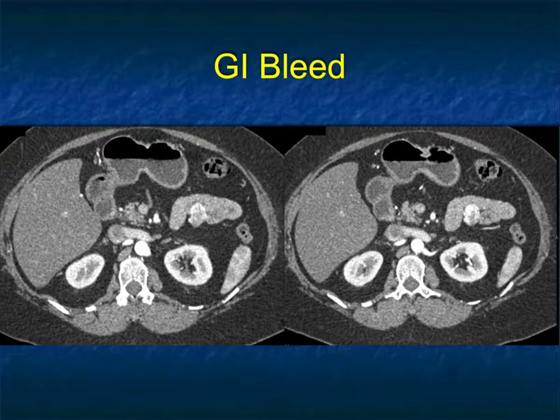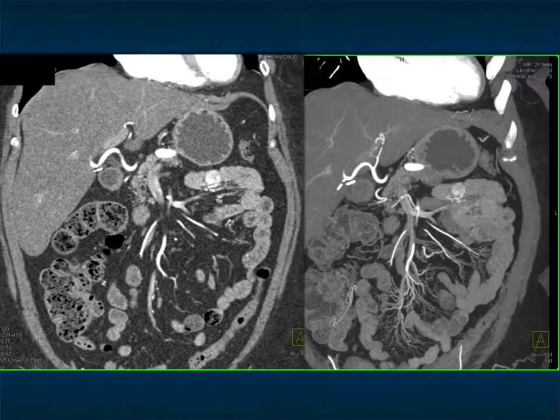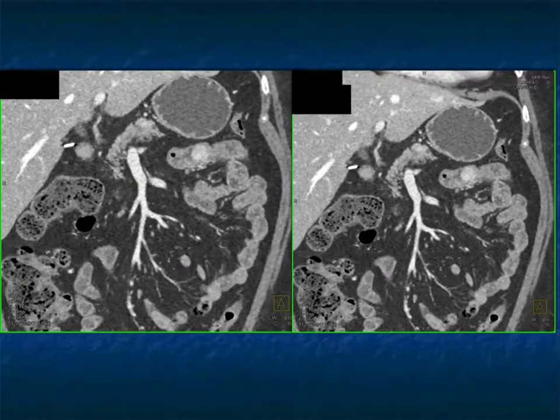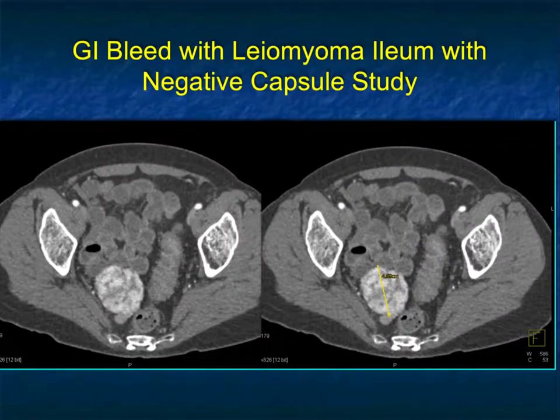Or in this case, proximal jejunum looks just like the other cases, but again, hypervascular, but you see it's kind of exophytic in part. That tells me GIST rather than carcinoid. Again, depending on what projection you use, you can make it look intraluminal, as on the coronals. But again, a beautiful example of a vascular small bowel tumor which bled, which was a GIST tumor. You could again see it on venous phase imaging, but you could see it begins to wash out.